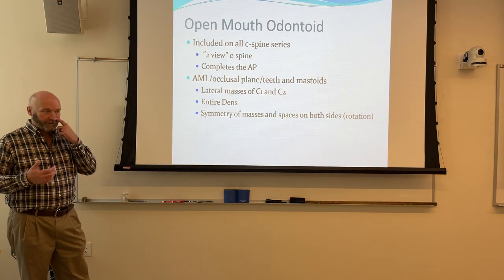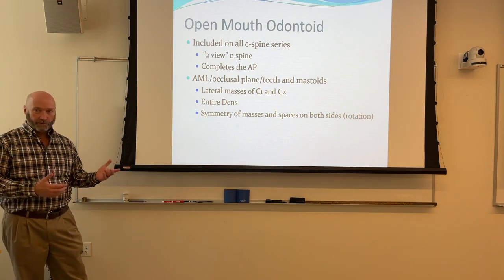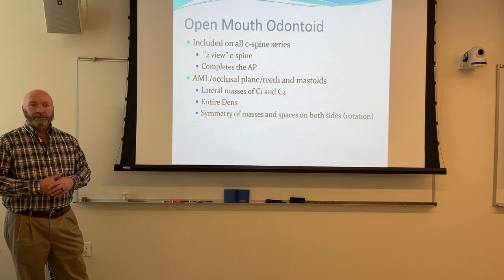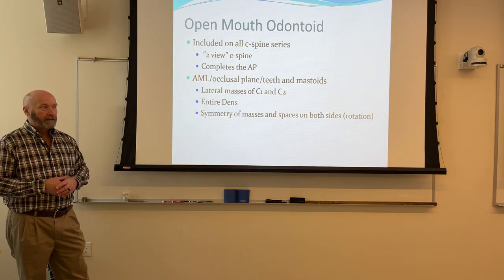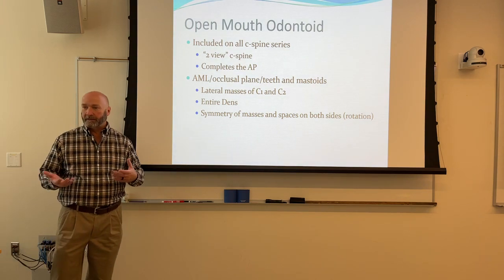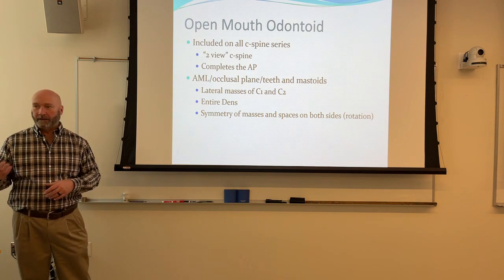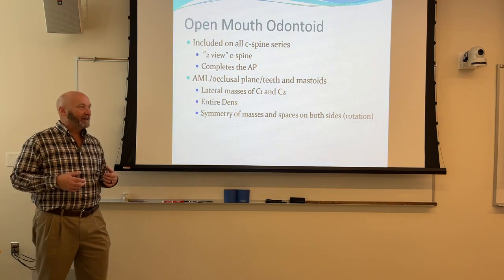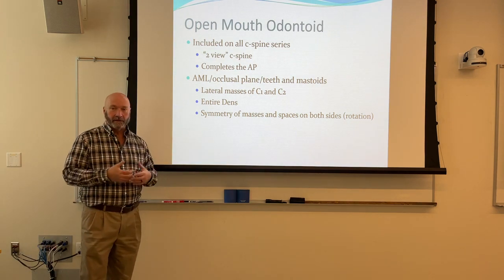Generally, when I would position for one of these, preferably the doctors come down by this point and remove the collar, or at least take the front of the collar off, so that you can have the patient open their mouth wide enough to actually get this. If you tell the patient, open your mouth as wide as you can, what are they going to do? Lean the head back. They're going to open their mouth real wide, and they're going to mess up your positioning of the AML.